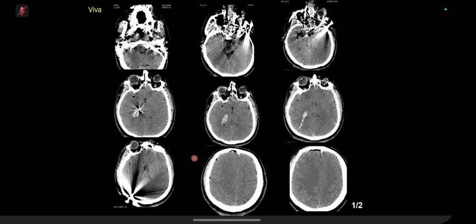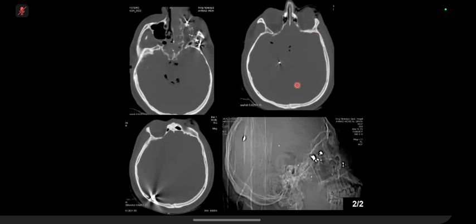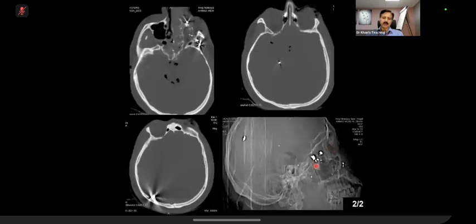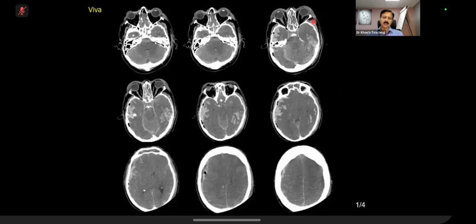I'm just trying to categorize the hemorrhage. What is this? What is this? You were worried about an embolization clip. There is, so this is metallic density. That's the hint. Oh, he's got a traumatic, so like a bullet injury or something like a sharp injury. I just wanted to show you this patient because otherwise you will get confused, as you did get confused. It's very easy. Shotgun and multiple pellets, and more or less brain dead.